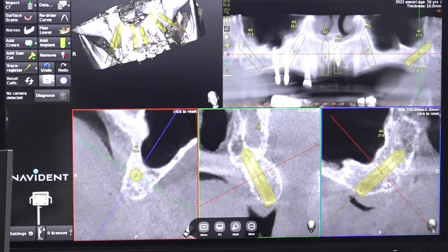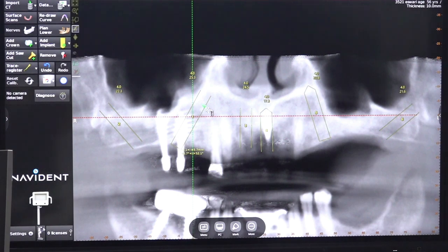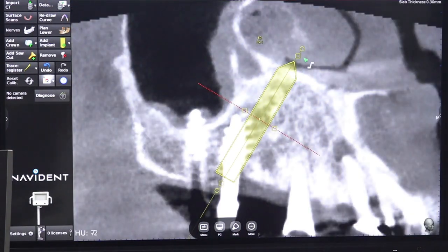Now we will see the right nasomaxillary buttress implant or right distal tilted implant. We will remove this single piece implant. Then we will treat this area as an extraction socket. That's it. So this is the double expansion. This is one expansion. This is one expansion. So starting point is this from this socket, implant socket, tilted medially.